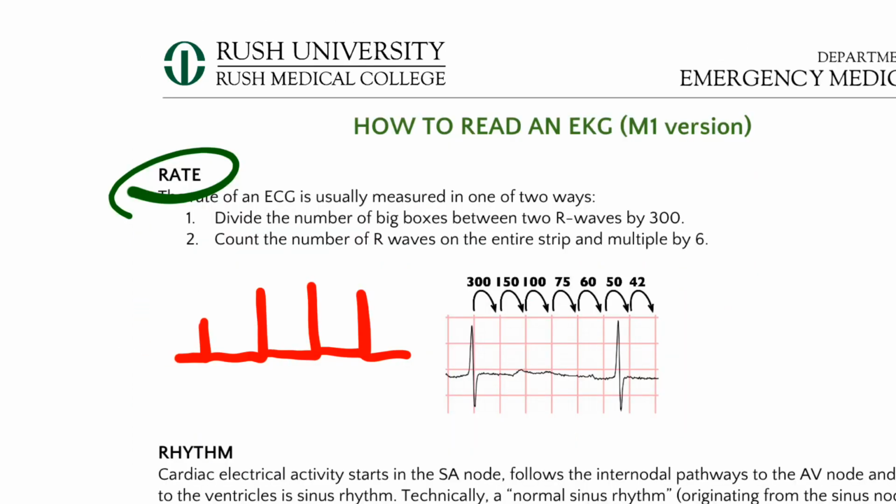And that is to just look at 2 neighboring beats. You can see here that here's one beat and here's another beat, and how many boxes are in between it. Each one of these big boxes represents 200 milliseconds. If you zoom in close, you see that there are 5 tiny boxes within there. Each one is about a millimeter in size, and those represent 40 milliseconds.